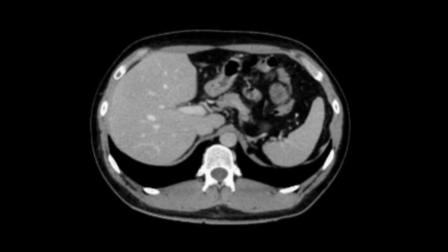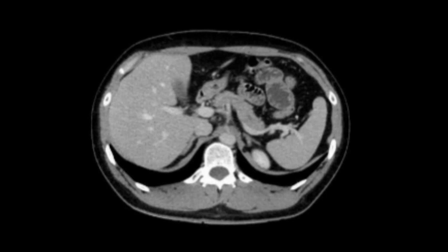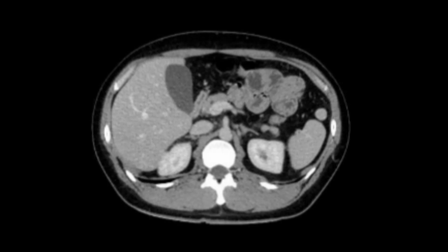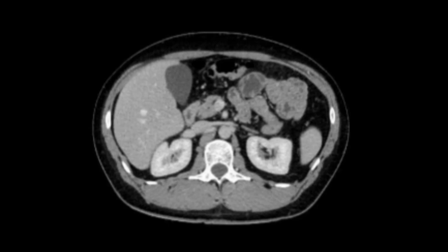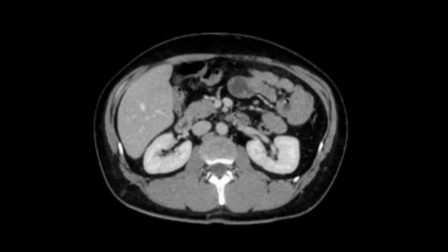You see the posterior part of this loop, it descends down now as the descending colon, while the anterior part runs horizontally to the opposite side of the abdomen. You see these air bubbles all the way in front here, running toward the liver.